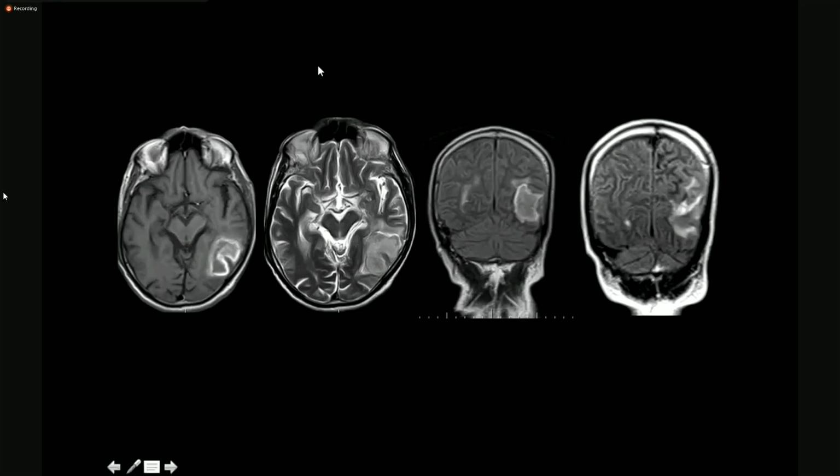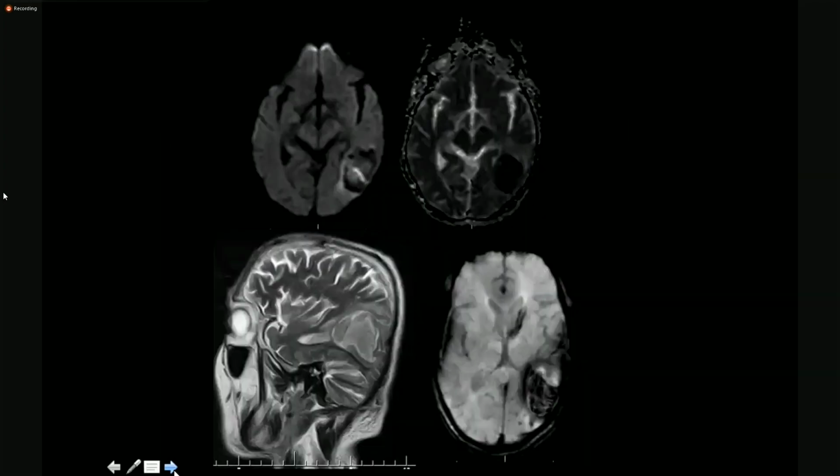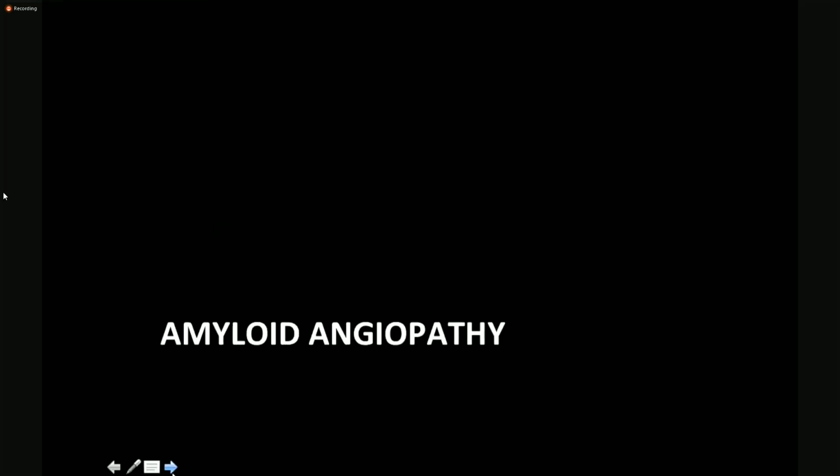I'm not provided with the post-contrast images. So considering the findings of central hypointense on T1 with peripheral hyperintense signals, this likely represents a mass lesion, which is showing hemorrhage at its periphery. It is also causing effacement of the ipsilateral adjacent ventricle and slight effacement of the sulci.